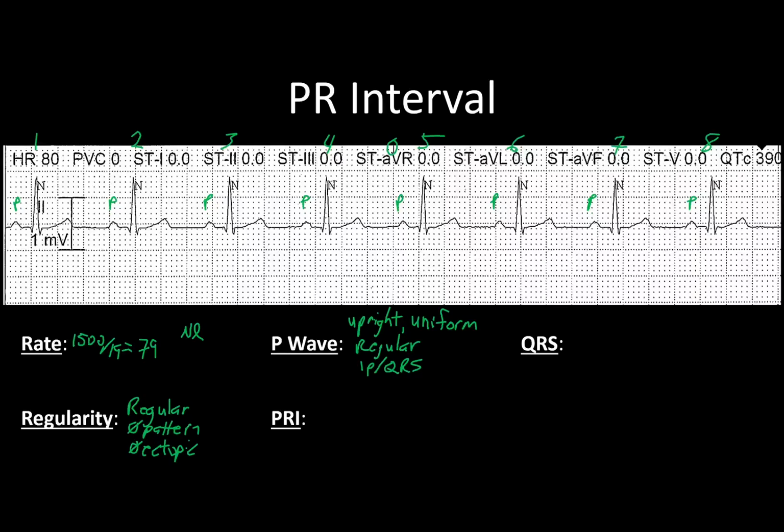Well, now that we've got our P waves marked out, it's time to start looking into the PRI. Now, you cannot measure a PRI without P waves. So how do we go about doing it? What's the easiest way to measure PRI? Well, we're going to start with a nice easy one. This is a pretty good one.